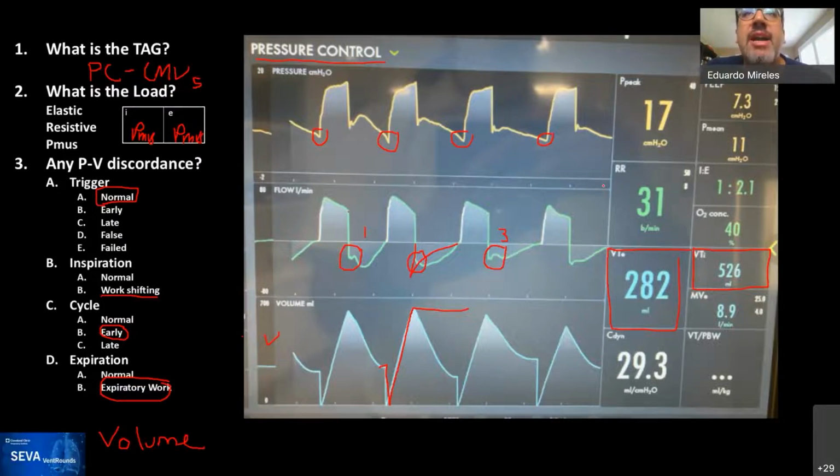There have been some devices that have been created that actually increase the pressure during the inspiratory cycle of the ventilator. And if you ever do, I have done this, in which you put a transducer into the cuff of the ET tube, what you see is that as the ventilator pressurizes, the cuff pressure actually increases during that period of the ventilator, just transmitting the pressure that is coming from the airway. Yeah, we published a paper on that, Sherry, I think it was last year or the year before, and we showed the waveforms, how that actually happens, like you said.